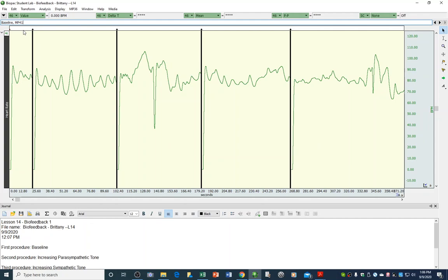So for your lab report, you're going to have to report certain bits of data. The default that BioPac leaves you with leaves a lot to be desired. Up here, delta T is a change in time. So it tells you how much time a certain epoch was. In order to highlight anything here, I need to go way over to the far right side of the screen and get from my arrow to my I-beam cursor. And then to highlight a swatch of data, I'm going to click and drag and then release when I'm done. And I've highlighted this little batch of data here.